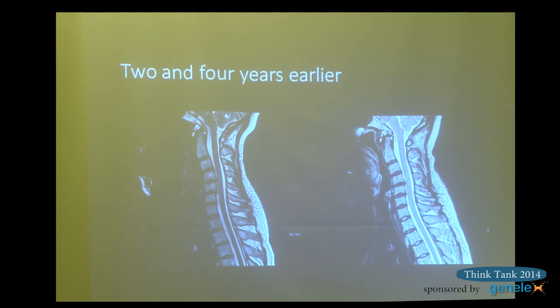craniocervical junction problems. And one of my frustrations is seeing this sort of thing and recognizing that it's a problem. But the two earlier studies were both read as normal.